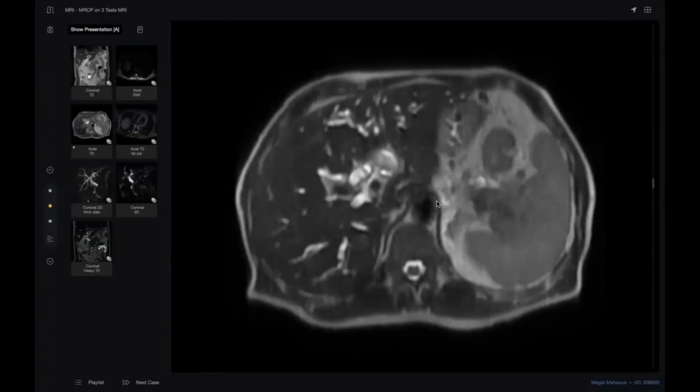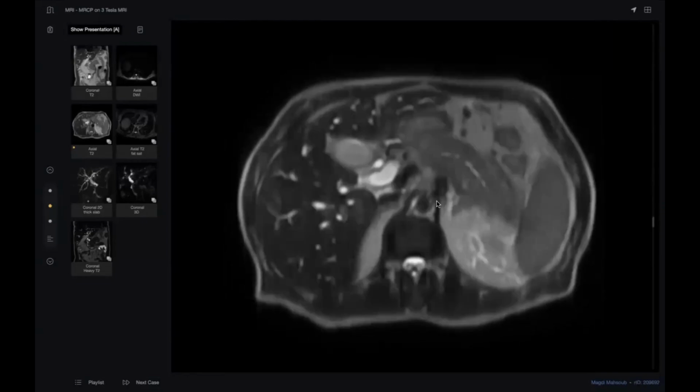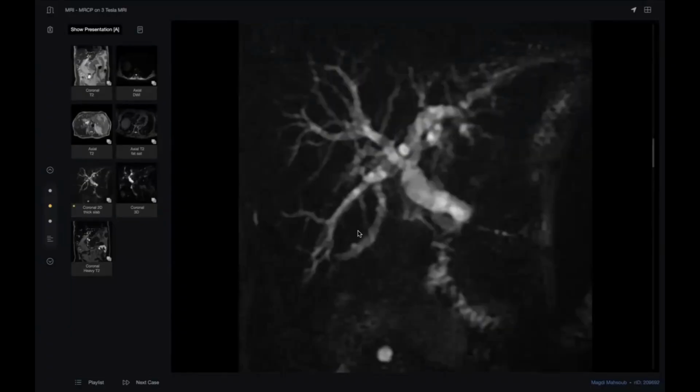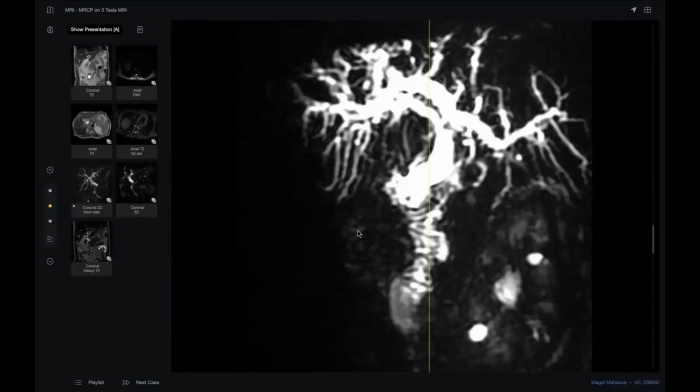You see? This is the CBD. The CBD is dilated, yes. And there is a hypointense, isointense mass lesion, which is noted just anterior to... I will help you. What happened here? Sir, there is abrupt cutoff of the distal CBD. No, look again. Look again here. What happened? This is obvious. Look at the biliary system. Look at the biliary system as a whole. Generally, what happened here?